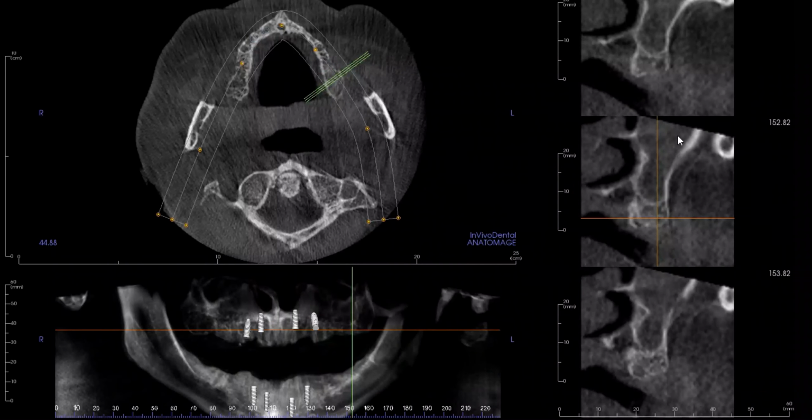As I'm coming around, his sinus is full. So a couple things we can do here. One is just refer to the oral surgeon and get clearance. Another one is take a CAT scan more superiorly so that we can capture the osteomeatal complex, which is the drainage port of the maxillary sinus, which is located up in this area. If the patient is not draining, I don't think we should go through and do surgery on these patients until they're cleared up. Sometimes it's just a matter of getting them on an allergy medication. Sometimes it's a sinus surgery.